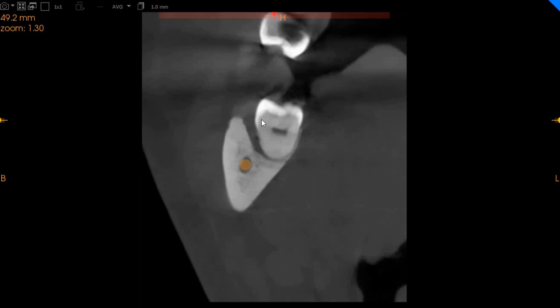We've got good space here, which does not need any guttering because there's a very big gap between the bone and the wisdom tooth. This gap is extending all the way to the apex as well. As you are moving distally, you will be able to appreciate that even though the wisdom tooth is more lingually placed, the inferior alveolar nerve is placed buccally, but it is significantly far away, approximately 2 millimeters again, from the wisdom tooth on the lower right aspect.